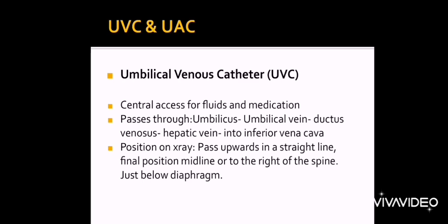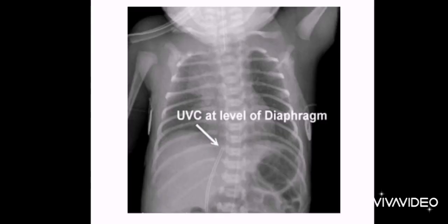However, when you're looking at the X-ray, it's to the left, but obviously we're thinking about the baby, and on them it will be to the right. So the final position should just be below the diaphragm in that straight line, and that's seen as quite a good position.